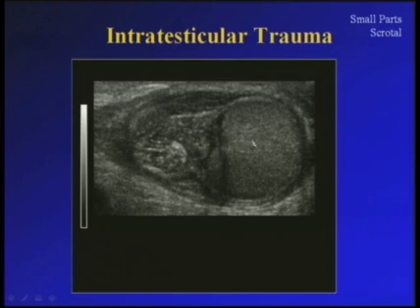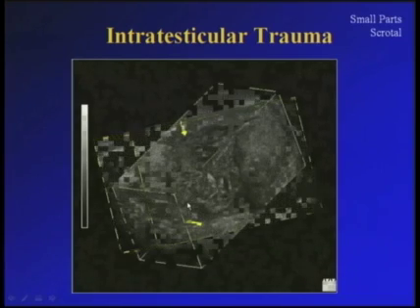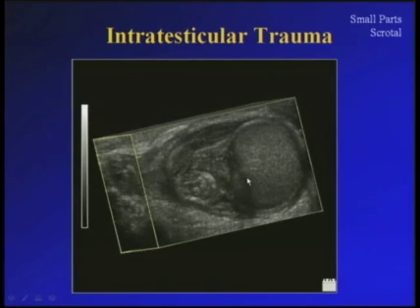Intratesticular trauma. It is an image corresponding to an intratesticular hematoma after a severe trauma. Very interesting because we don't have lesion here inside the epididymis, only intratesticular.